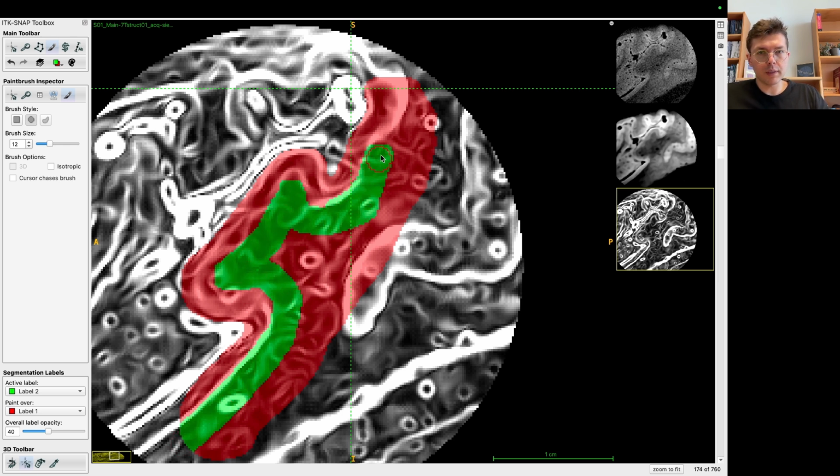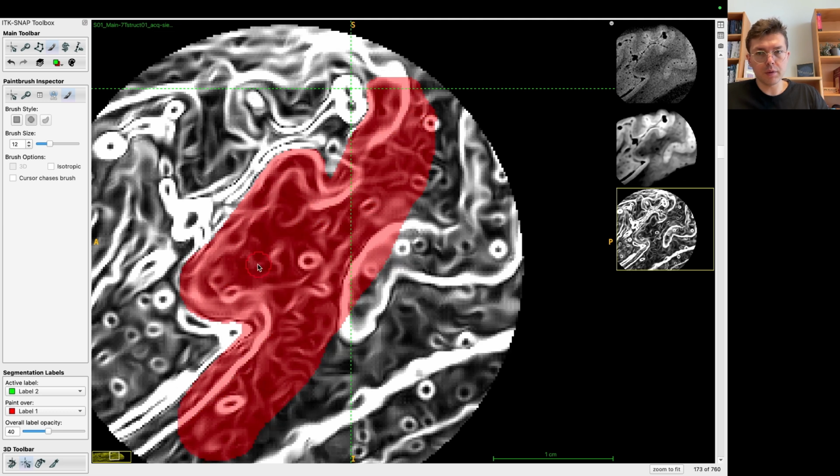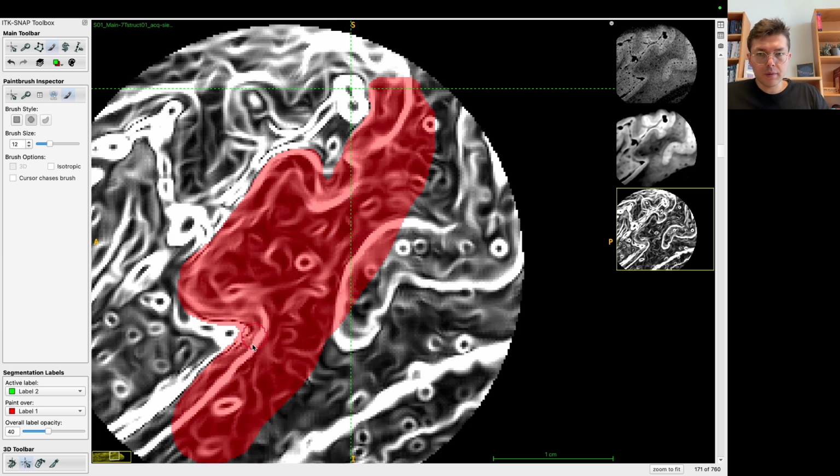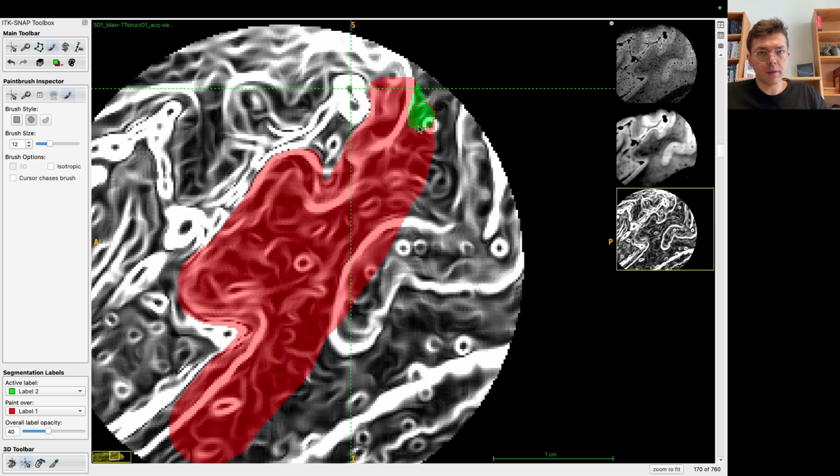Okay, now I kind of start seeing it a bit better. Maybe you notice, see, that area, this white stripe kind of coming out of it. And that's what I mean. Maybe the A1 ended, and that's why we are picking up a way better white matter gray matter boundary contrast, as there are fewer axons entering from the white matter there compared to the A1 region, something like that.